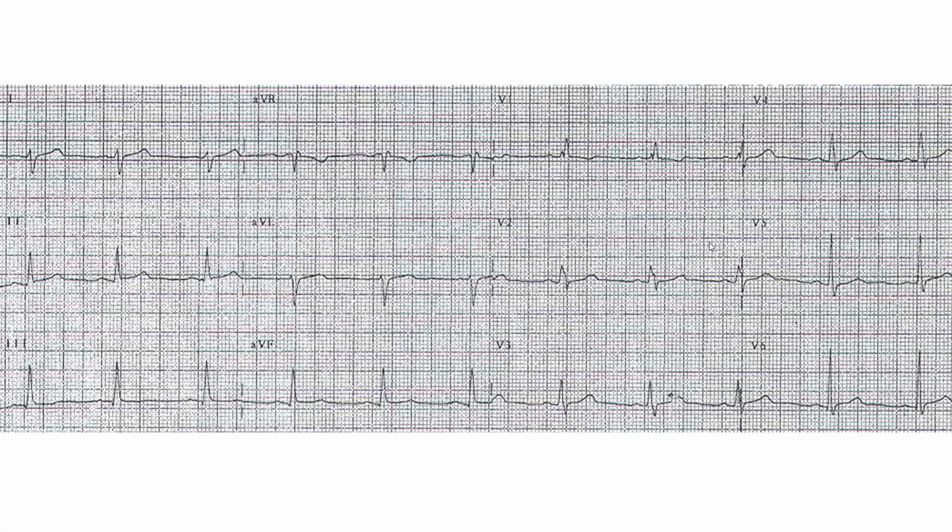I want you to look at this EKG and tell me what the diagnosis is. What do you use to call right bundle? What duration do you need for incomplete and complete? Based on the ACC criteria, in order to define complete bundle branch block, you need to be over 120 milliseconds. And incomplete bundle branch block is between 110 and 119 milliseconds. Less than 110 milliseconds is not a bundle branch block.